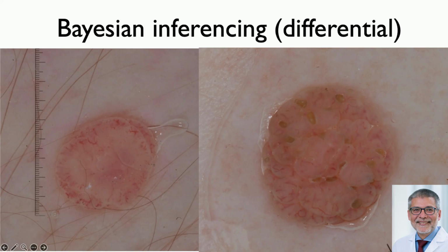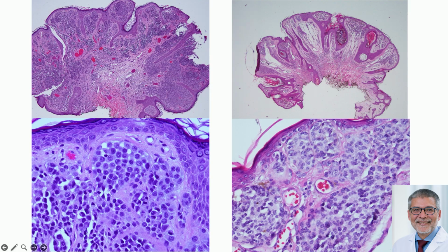And in fact, if you look at the vessels at the perimeter, there's not a single comma vessel. They're all weird polymorphous vessels. It doesn't fit. And when it doesn't fit, you biopsy. The one on the left happens to be a melanoma. The one on the right is a nevus. That's how dermoscopy helps, right?